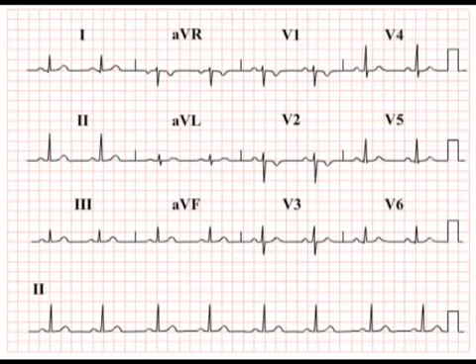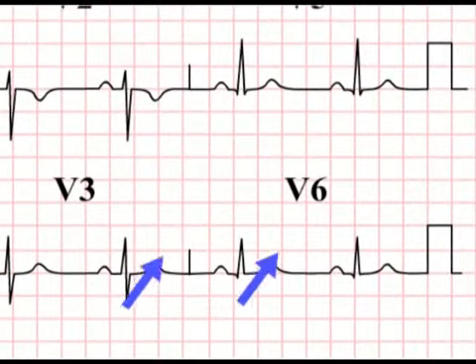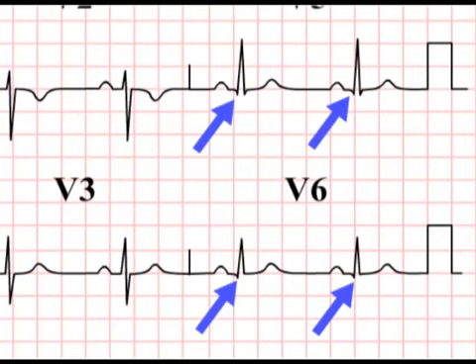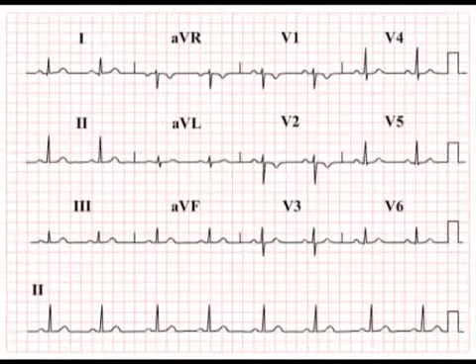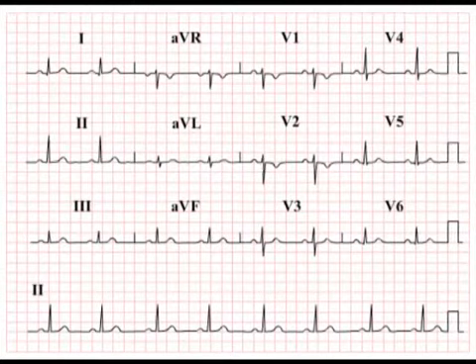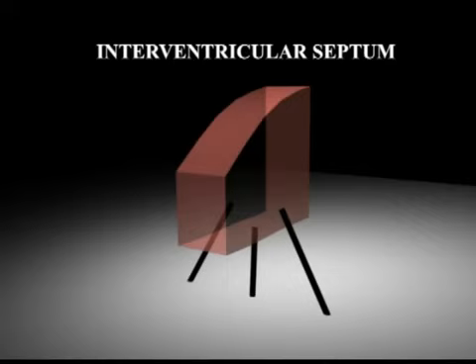We've seen that early left to right depolarization in the interventricular septum is the key to understanding the potential existence of small physiological Q waves in any of the left lateral leads, exemplified here in leads V5 and V6. We'd now like to refine your understanding of septal depolarization and physiological Q waves. As shown here, the interventricular septum is of course a three-dimensional structure.